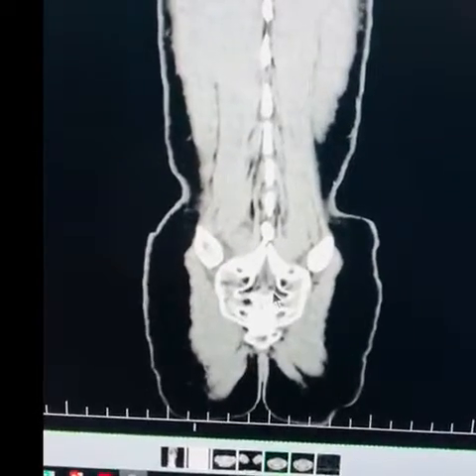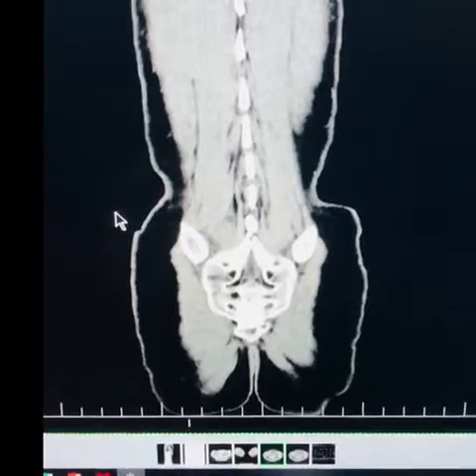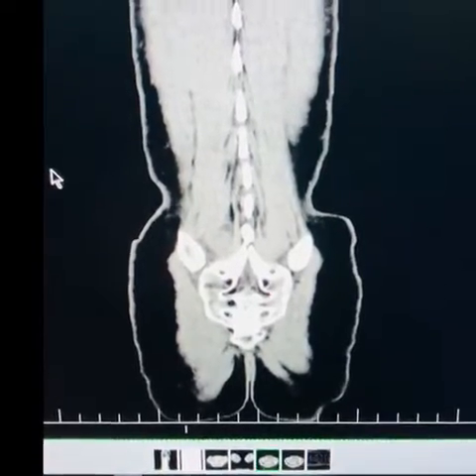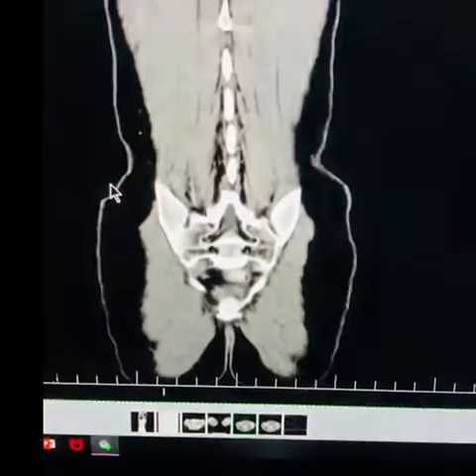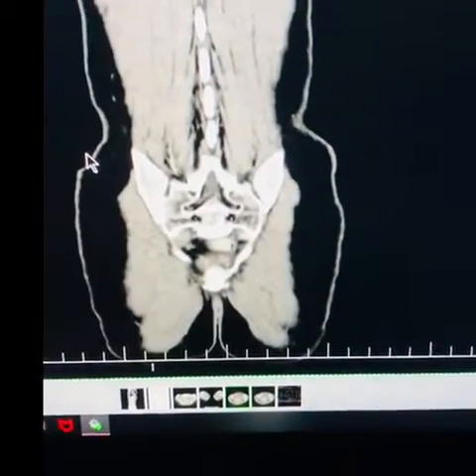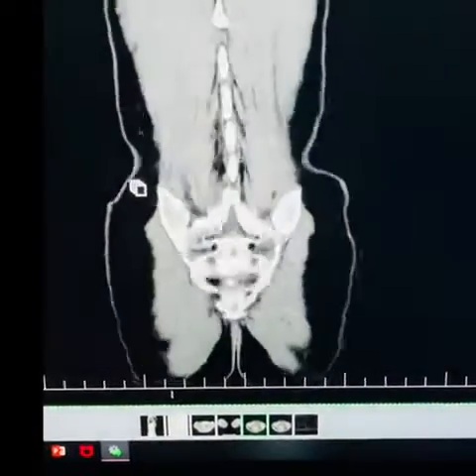Hey everyone, it's Austin here coming to you live with a CAT scan of the abdomen and pelvis. This is part one of a multi-part series of CAT scan imaging and anatomy. We're just going to run through general anatomy right now in a general view, and then we're going to break it down in future sections and go from there, y'all. So let's check it out.